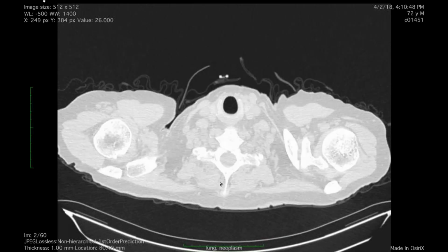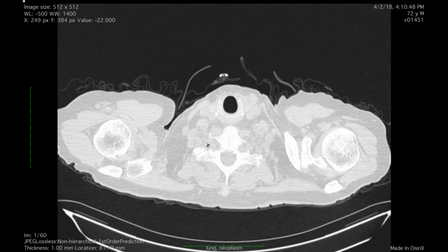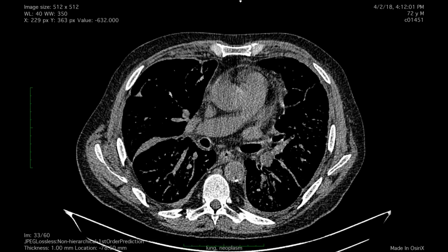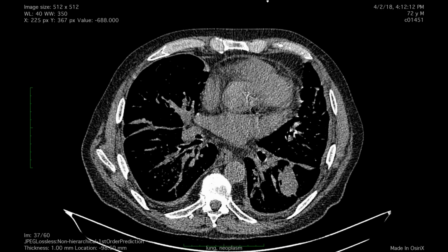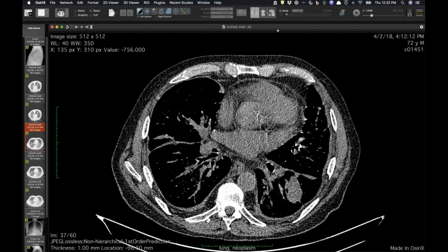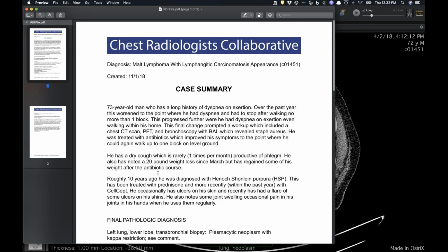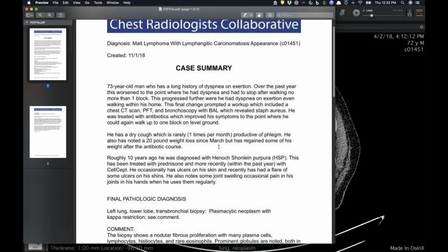And something else, his kidneys were fine, or I guess we didn't get them, but his bones, we didn't see anything, or any other organs, and his heart looks okay. But on a transbronchial biopsy, I will show you what the pathology showed. Lymphoma. Yeah, exactly.